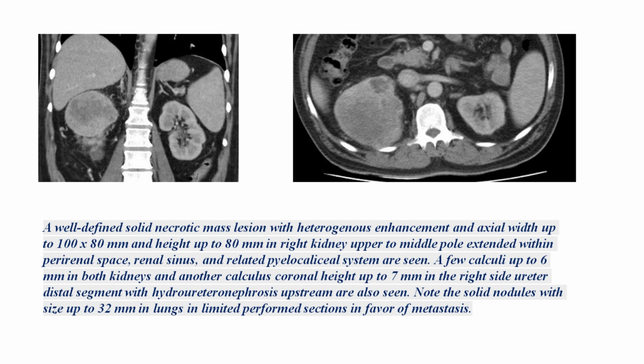Note the solid nodules with size up to 32 mm in the lungs in limited performed sections, in favor of metastasis.